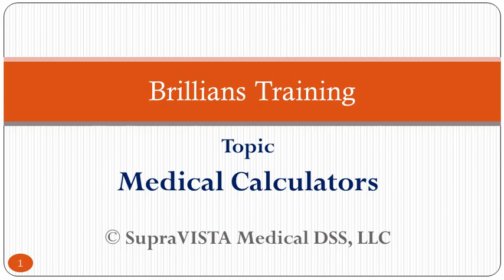Brillians is the new name for the application previously known as SupraVISTA. Today's topic is medical calculators in Brillians.